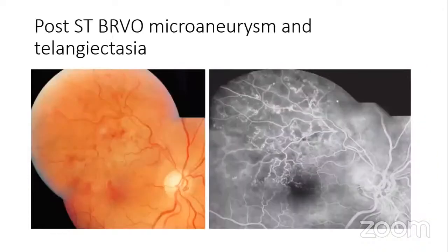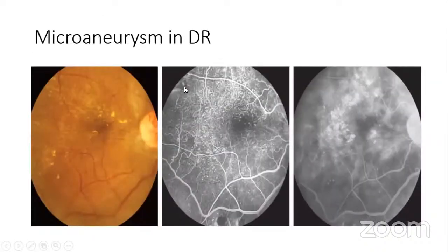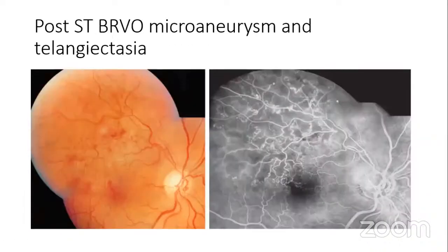Now, this one is clearer. When we discussed hypofluorescence, we had an image from a patient who had branch retinal vein occlusion. Okay. Now, let's look at this. See the fundus photo. The patient evidently has some form of telangiectatic vessels, and then some of the vessels are bridging.